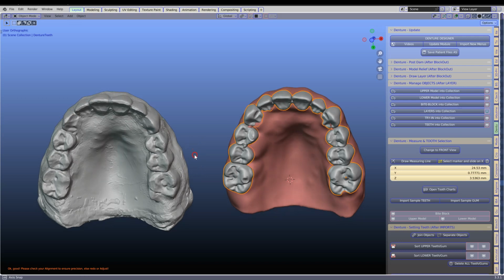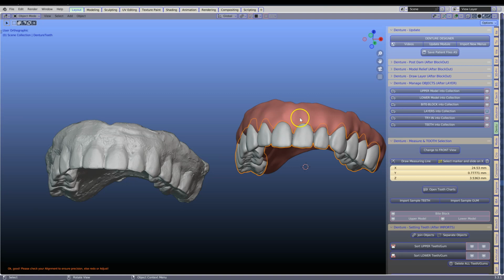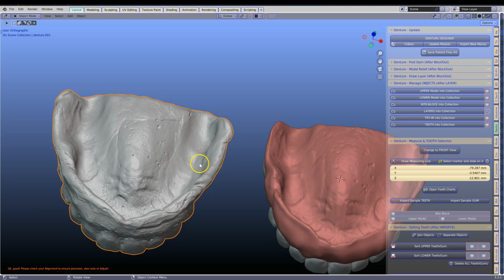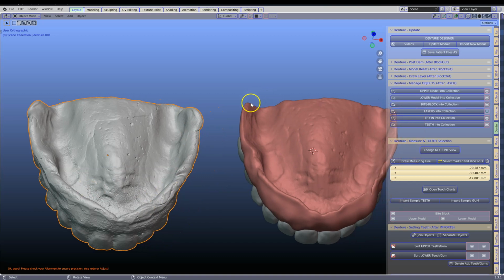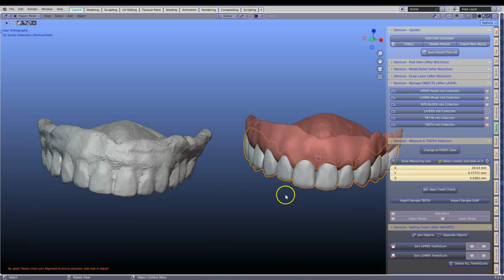This is an amazing case that I wanted to share with all of you. Now, the denture is a split denture, so it's got its cavities. Now, this had been printed and it had been put in the patient's mouth, and we needed to get a new base because this is a new impression on the inside. Now, how do we get this impression, the new fitting surface, to go into this fitting surface and then reprint it separately so that we've got our teeth as well?